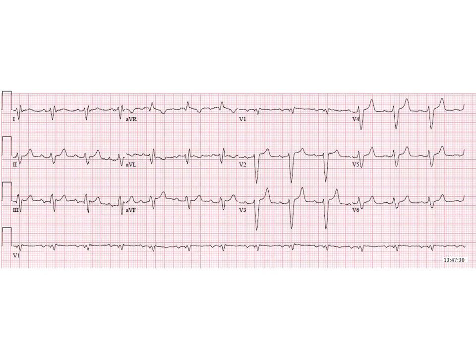What you're seeing here is actually a prolonged QRS segment. And what you'll see causing this is tricyclic antidepressant toxicity. So if someone overdoses on any one of the TCAs, it prolongs their QRS. And that can be really dangerous. It's not something that you want to mess around with. And if you've memorized your pharmacology already, you know that TCA toxicity leads to cardiotoxicity. And this is how. The prolonged QRS segment can lead you into dysrhythmia and cause death.